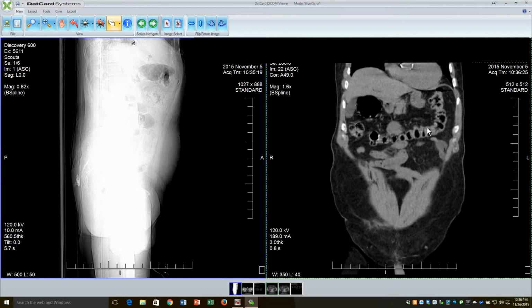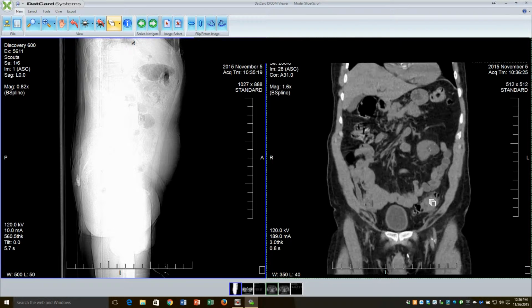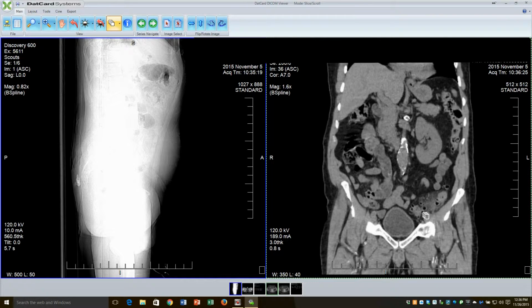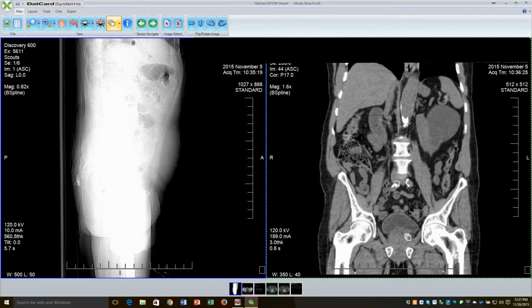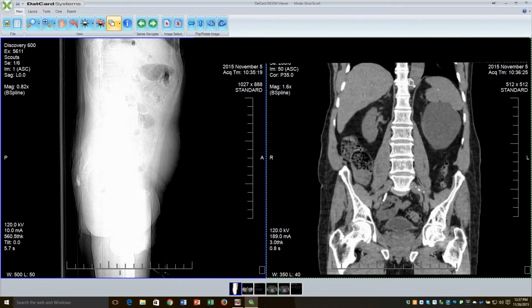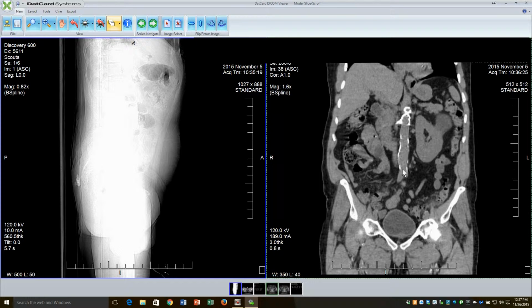Colon, transverse colon here. And then as we move, we can see the area of sigmoid diverticulosis and diverticulitis here. This sort of haziness that you see in the fat right here. It's all hazy. This is sigmoid diverticulitis right here. Here's the bladder. Here's the prostate gland. He's got a pretty generous sized prostate gland. And then here's that giant cyst on that left kidney. So the spleen is here, and here is the aorta, which has a lot of calcifications in it too. Right here, the abdominal aorta has lots of calcifications in it.